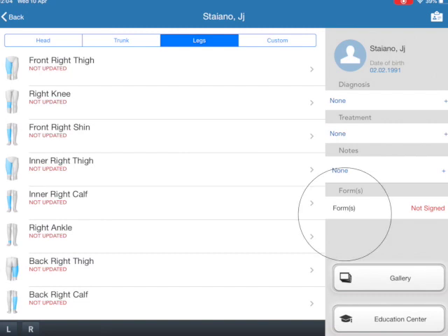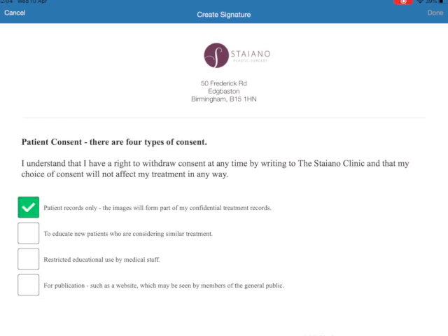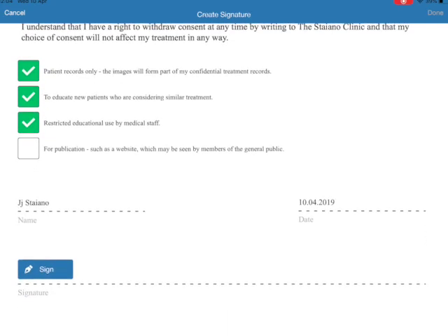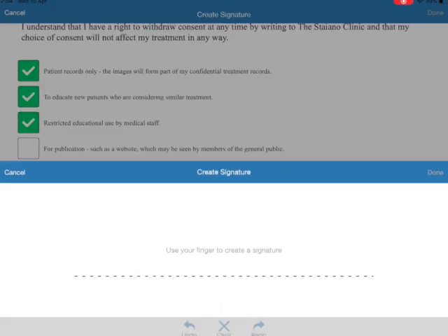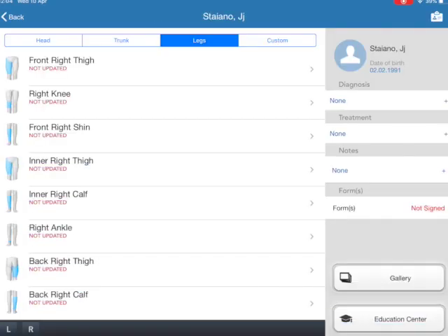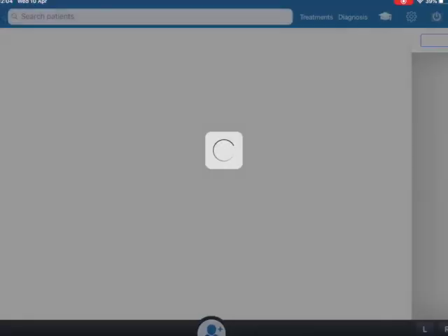We've also got on here a consent form, so this is for post-op. Once they've had their photo taken, you can get them to consent to whatever they want to consent to, and then you can get them to sign the form if you want to get consent for the photos on there. And it's just really helpful for us all to share photos.